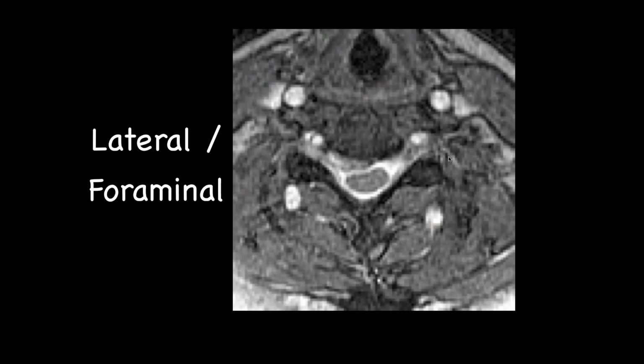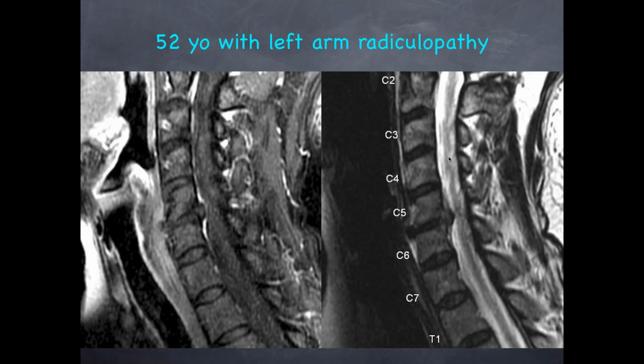Yeah, so I just wanted to point out. So how is it positioned? What's the axis in sagittal oblique? Is it tangential to the vertebral body? You do it at about a 45-degree angle. 45. Yeah, but the way they set it up is they set it up.